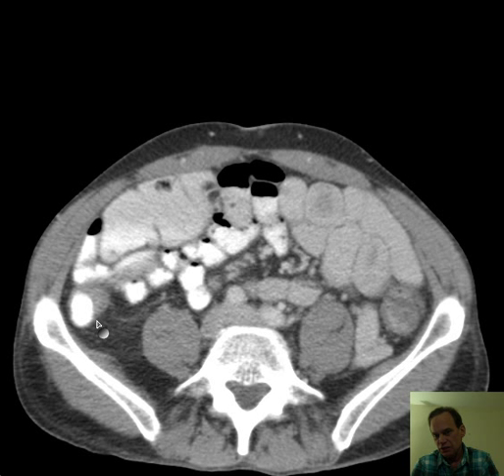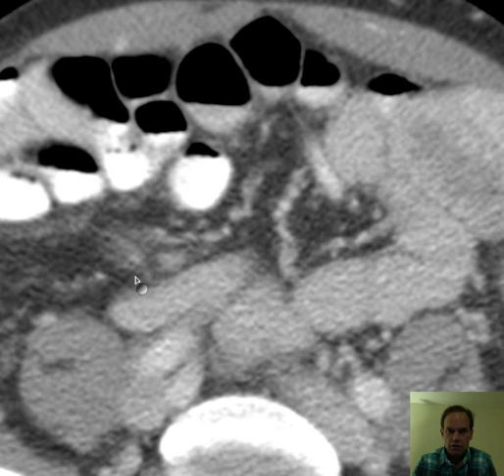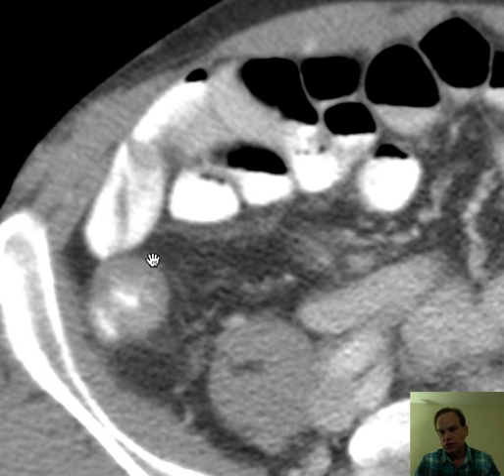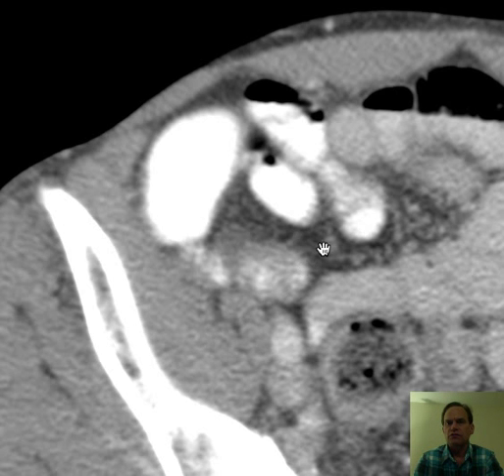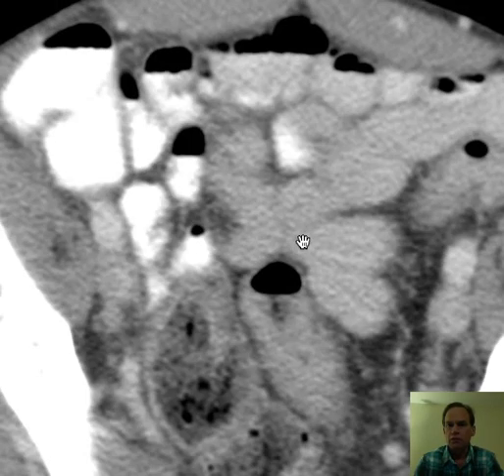Even though it looks thickened, usually it looks lower attenuation, boggier, more edematous, and with this much bowel wall thickening, you would really expect to see some shagginess around the border, some ill-defined margin, some stranding into the adjacent fat. You could argue maybe there's a little bit there, but that looks like vessels, and once you get above and below that point, it's not as impressive. So it has signs of Crohn's disease, probably some chronic thickening of the wall of the bowel there.